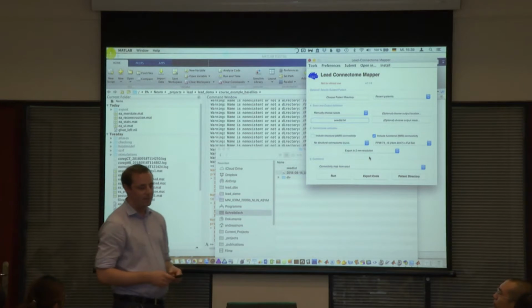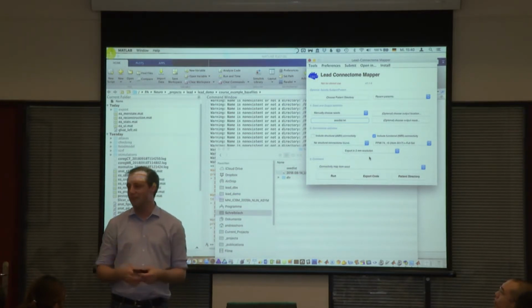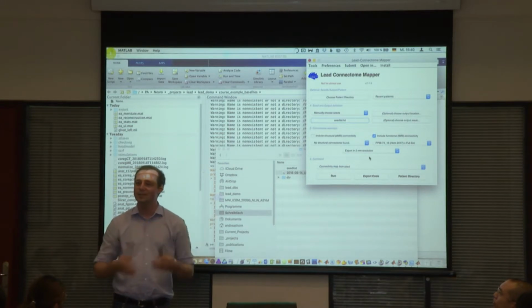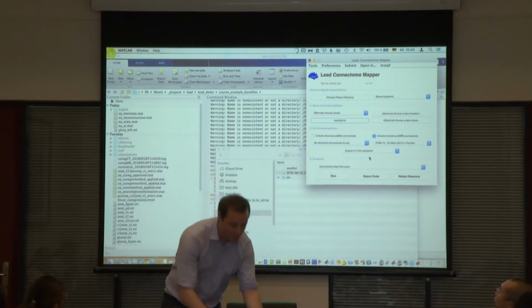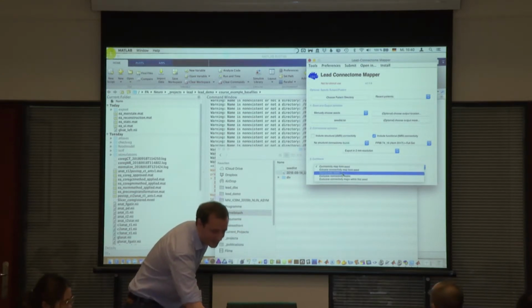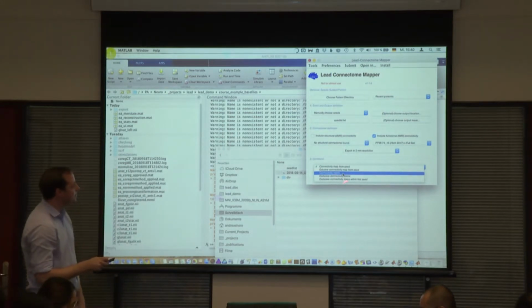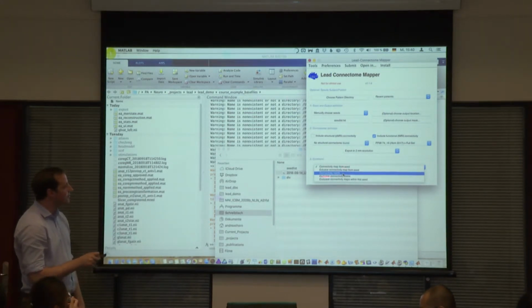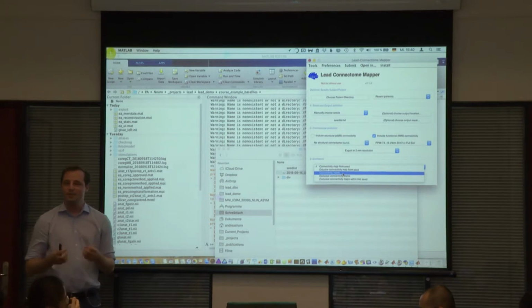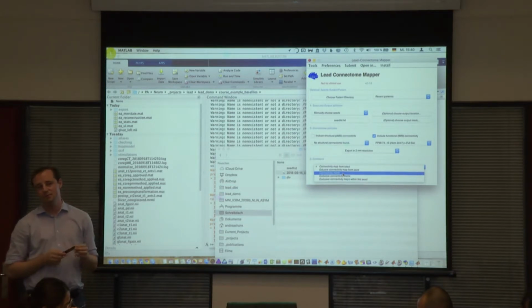What we can then do is select an SMA ROI and 2 VTA ROIs, and then we would know the connectivity between them. And to do so, we then have to say connectivity matrix here. So connectivity matrix instead of connectivity map from seed will just give us a seed by seed matrix of how strongly these are connected.